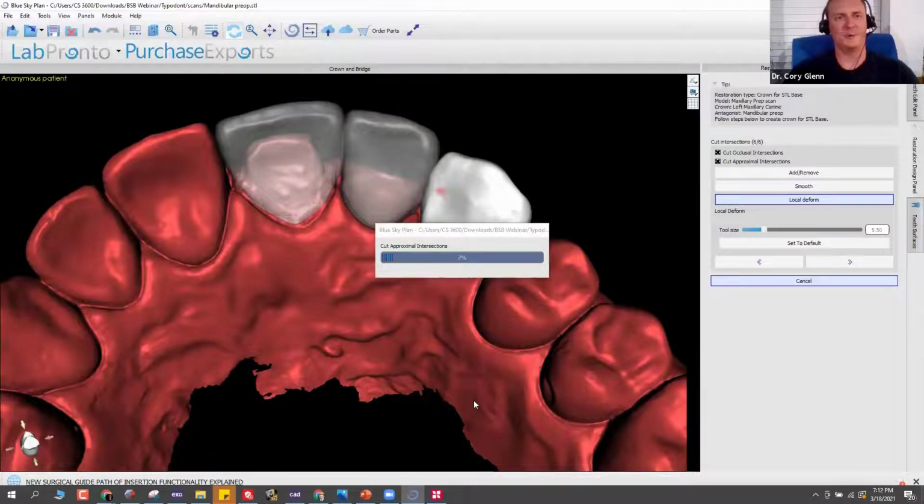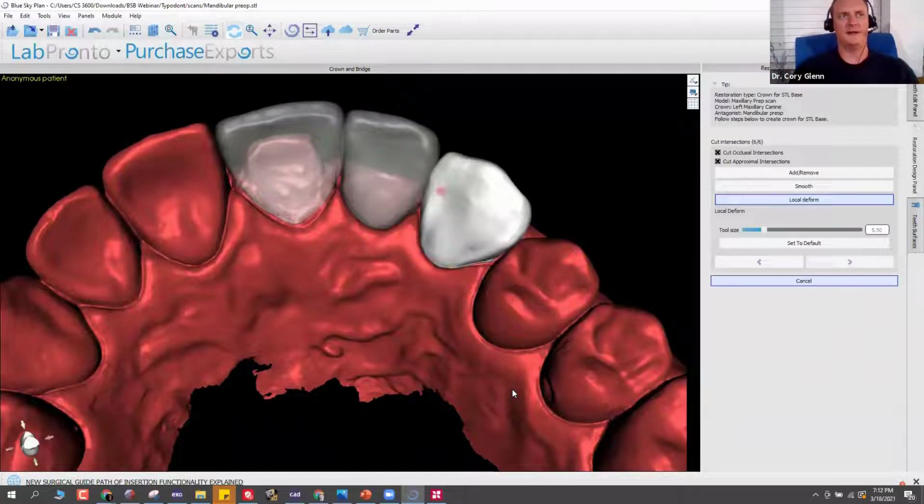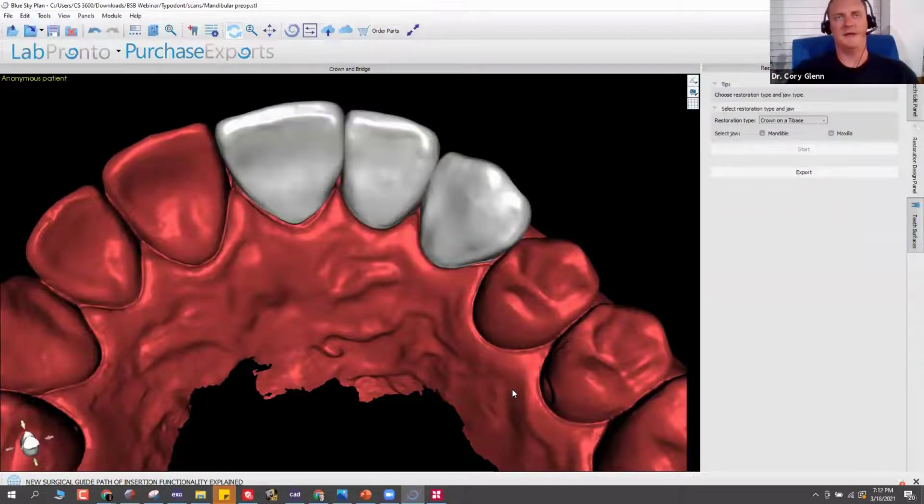But long story short, the software is going to allow you to pull in their models, rotate the teeth to ideal, and then it runs it through an algorithm. You tell it how many steps you want, how many trays, weekly or bi-weekly, and it runs it through those parameters, and then will generate those models with the teeth being successively moved, and you just print those and suck them down.